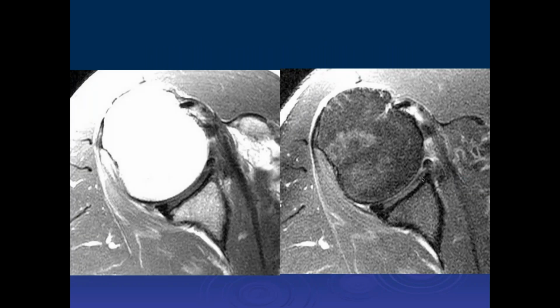Okay, let's see. Sam, what do you think of this one? Anterior labrum is irregular. There's a structure just anterior to it, which I guess is probably a ligament. Well, actually, here's the anterior labrum, and there's a signal at the base of the anterior labrum, right? Yeah. Whereas it's a normal posterior. So I would be concerned about a tear.